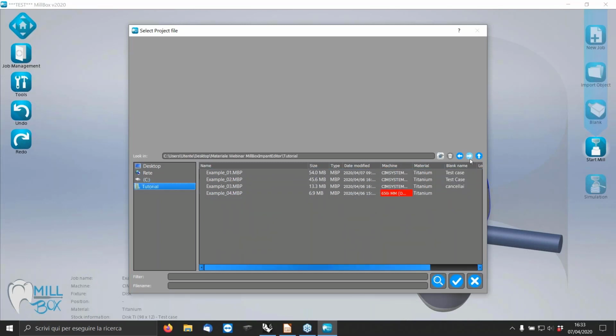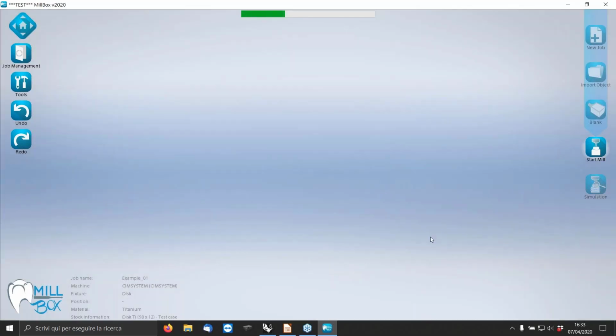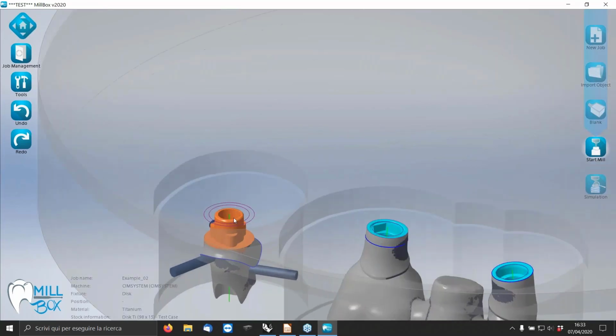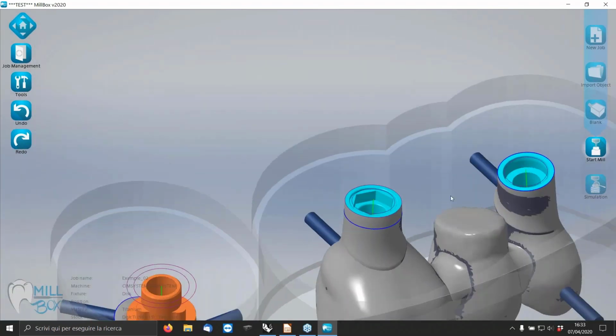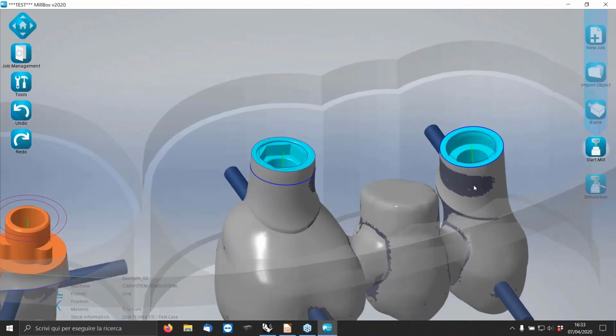Obviously, you can replace the connection for anti-rotational and non-rotational. But in this case, we have a problem. Normally, we can't use an anti-rotational and a rotational one. I know that we can do it, but normally we can't.